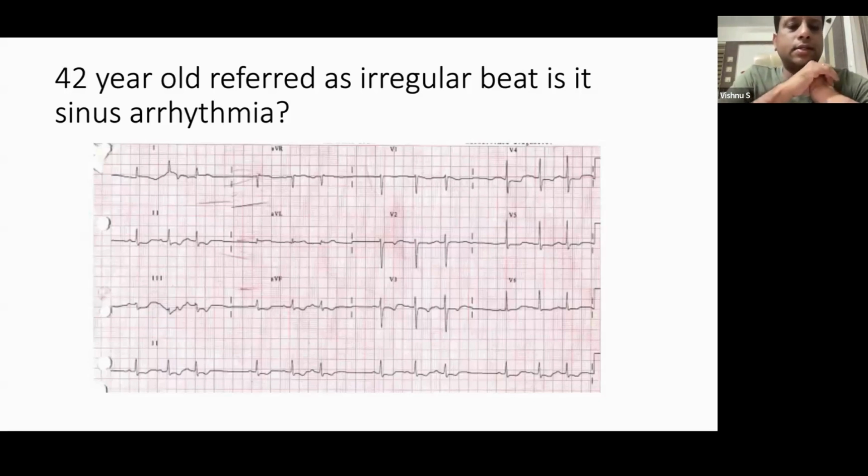Can anyone read this ECG? No need of telling any diagnosis. Is it sinus arrhythmia? That's the first question. With sinus arrhythmia, you should always think of the possibility of SA exit block also. This sinus arrhythmia you already know: the PP and RR intervals vary, PR is constant.